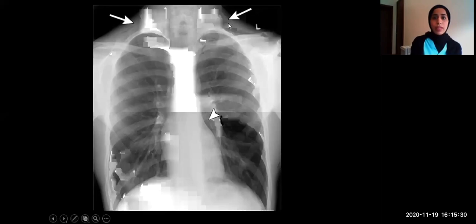So the neck, lower neck, cervical soft tissue show lucency and air here, suggesting surgical emphysema. Additionally, if you see a surgical emphysema, look carefully at the level of the lungs if there is any associated pneumomediastinum or pneumothorax.